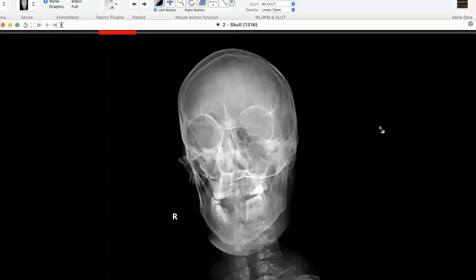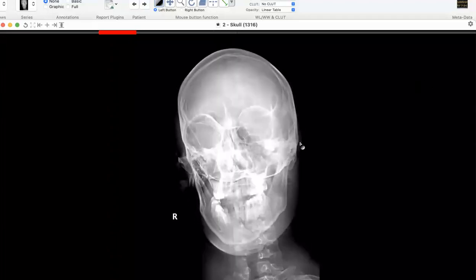So we'll start the discussion now. This was your first case. Also, I'll open the chat if anybody wants to ask any questions. So you were spot on. There's a fracture here, and the important thing to mention is the ring structure of the mandible. Look for that, diligently look for the second fracture.